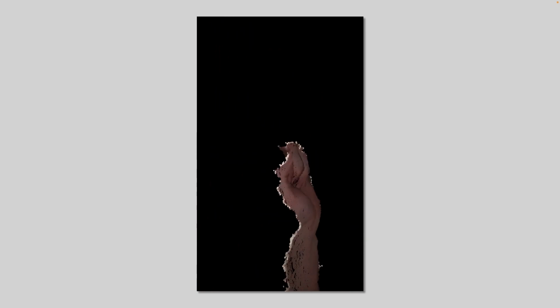There is the potential to improve this, for example by recording a point cloud of the hand. This can be done using the same TrueDepth sensor that I used in my project. This video of a point cloud that you can see, for example, was recorded using said sensor. Despite the potential for improvement, my method performs well, and I think that computer vision tremor amplitude measurement has the potential to help to improve the quality and accessibility of Parkinson's care in the future.